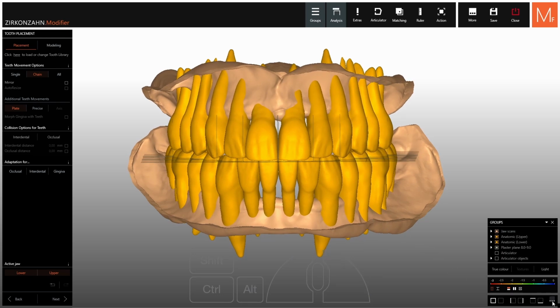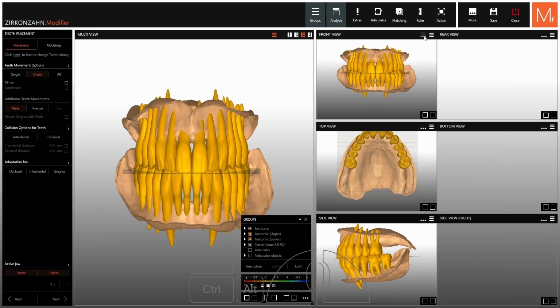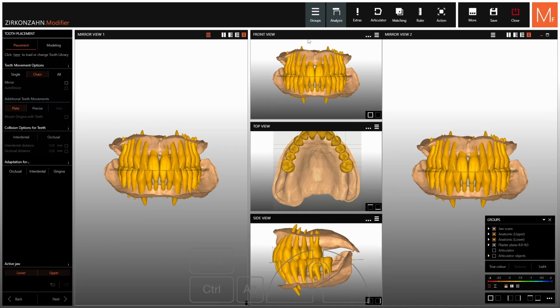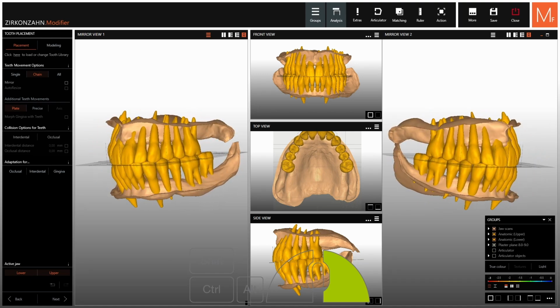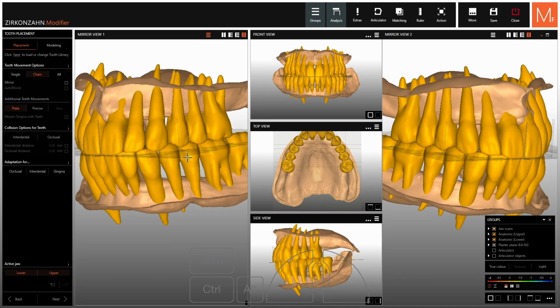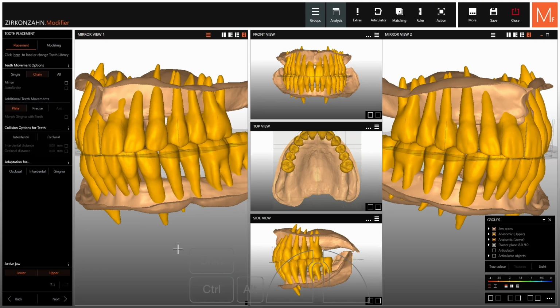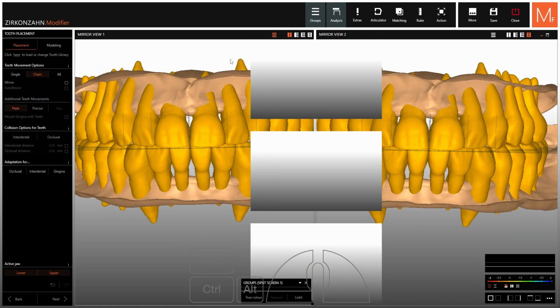If we click on the 3 points in the corner, below the group window, we have the chance to activate the multi-view. The multi-view can give us a helping hand during positioning and designing our cases, since you get predefined viewpoints of your situation with individual group windows, while you always have an active window where you can freely rotate. So if we change something about our setup, we will see it is going to be changed in all the other windows as well. We can also switch between different layouts.